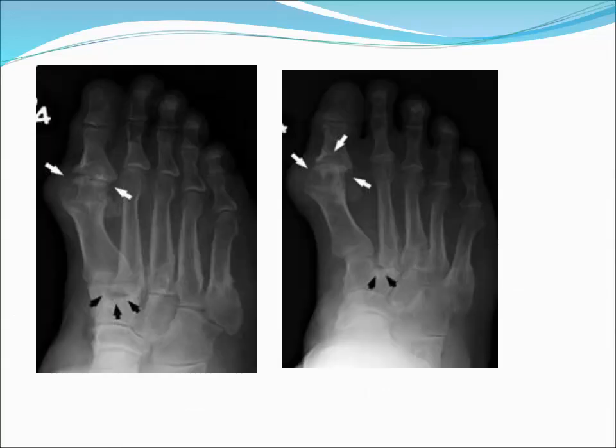Figures 1 and 2, AP and oblique radiographs: large erosions with sclerotic borders and an overhanging edge of cortex, most evident at the base of the first proximal phalanx, are present at the medial and lateral sides of the first MTP joint (white arrows), with prominent medial soft tissue swelling and associated hallux valgus deformity. Erosion is also noted at the second TMT articulation (black arrows). The first MTP joint space is relatively preserved. Other erosions are present near the TMT joints. Mineralization is normal and no soft tissue mineralization is present.